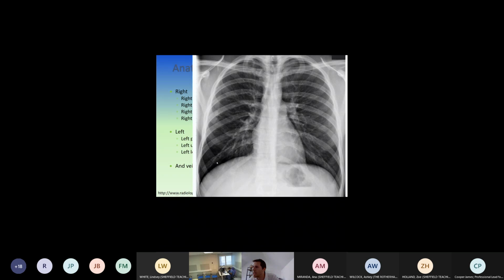Next, I'm looking at pleura. One of the important things in chest X-ray interpretation is being able to see a nice crisp outline of both hemidiaphragms. We don't see it behind or through the spine, but we need to see a nice sharp crisp outline. This will make more sense when I come on to consolidation, but if we lose that outline, then there is a pathology touching that diaphragm.